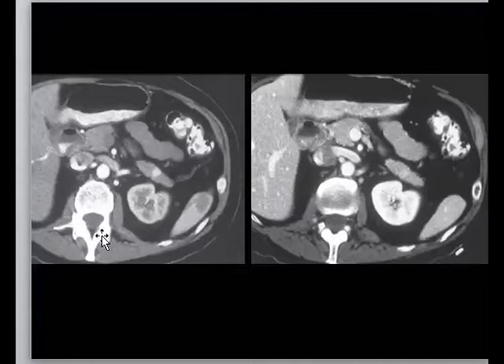So yeah, insulinoma will be one of the best differential diagnoses because it is hypervascular and it is in the pancreas. So islet cell tumor, what is the most common one? It is insulinoma. So neuroendocrine tumor again, yes, it is a neuroendocrine tumor. And what is the second most common one?